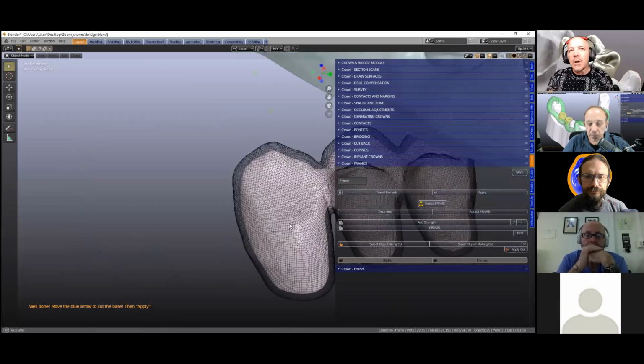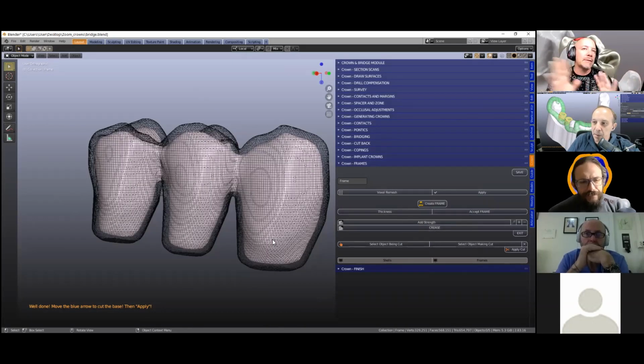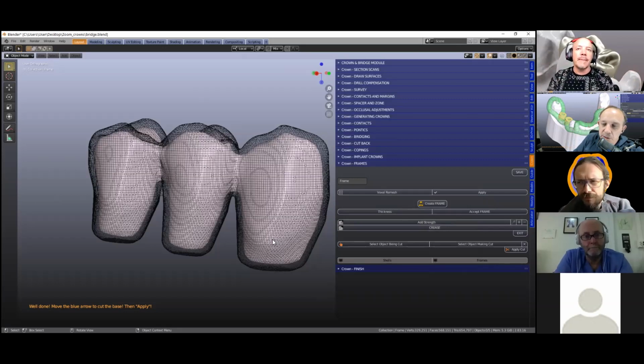They're then joined to our abutments and we've got the framework finished. Okay, so that's still to come. I'm still working on it. It's 80% completed.